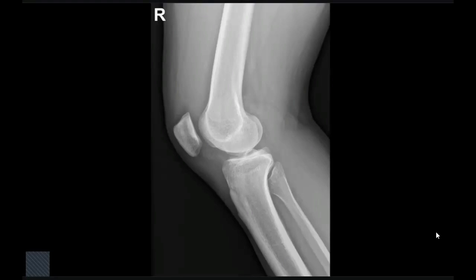In my routine practice, I would also check the other orthogonal view, which is a frontal radiograph, to confirm. What is the normal distance? Up to 1.5 millimeter. So, what will you do next for this patient? After checking the other orthogonal view, I will alert the referring clinician and advise further assessment by MRI to rule out ACL tear.